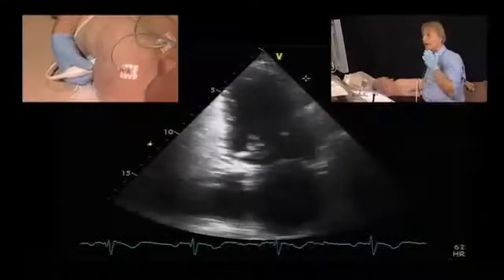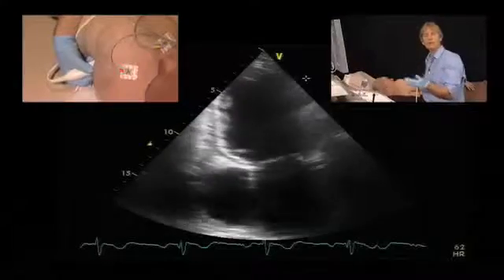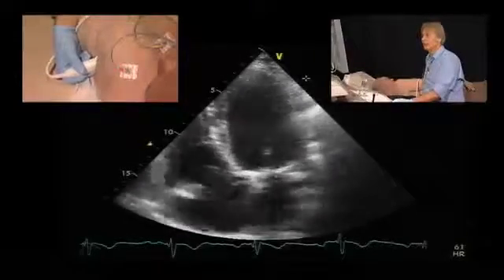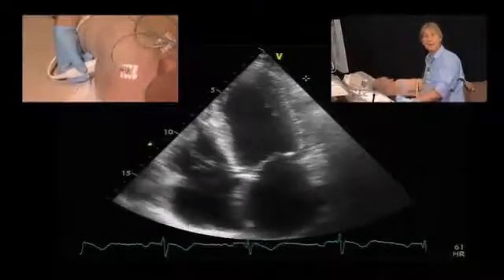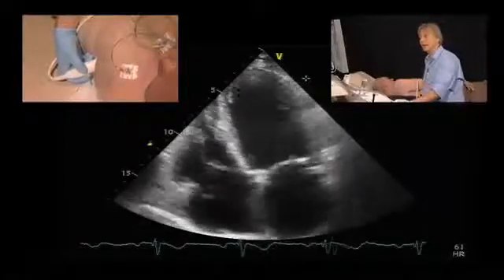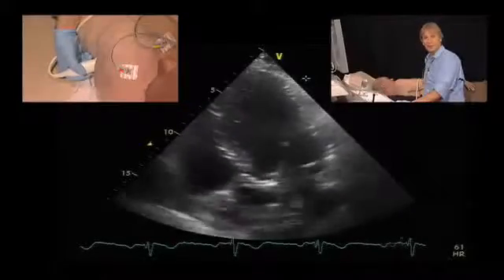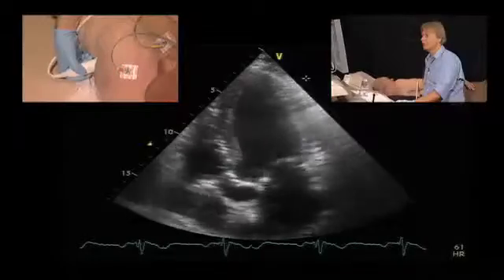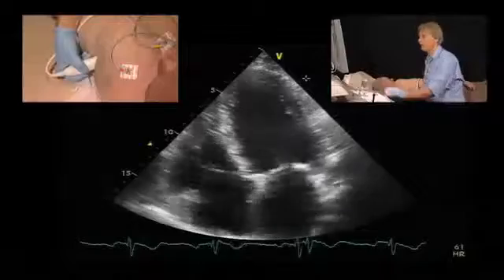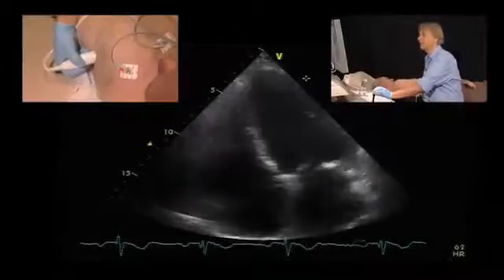Now, if we take all these factors into account, this is a patient who has a low flow, low gradient situation, so we're underestimating the severity of aortic stenosis, and particularly in the setting of an inferior infarct, this is not good for the patient because he has increased afterload. The question will now be if he will benefit from aortic valve replacement, and this will be clarified with other tests, for example, stress echocardiography. He already has an appointment scheduled for next week.